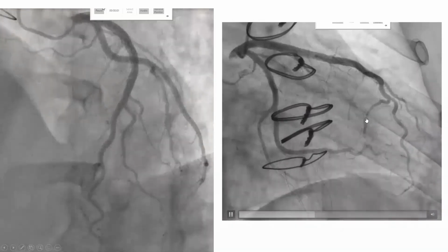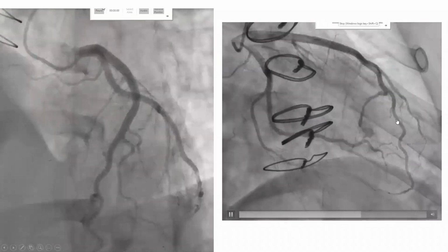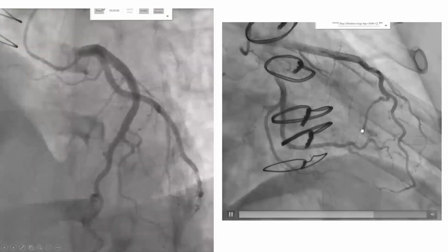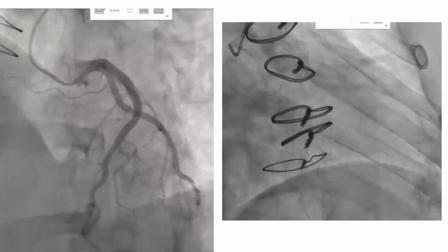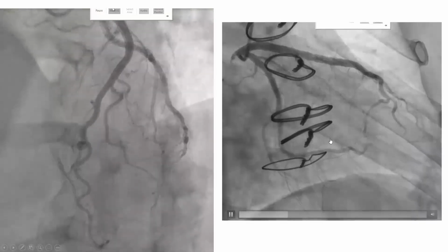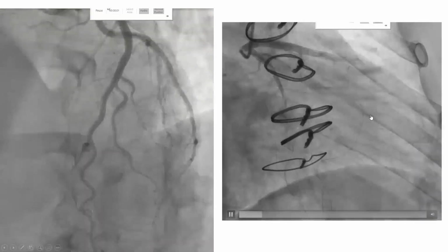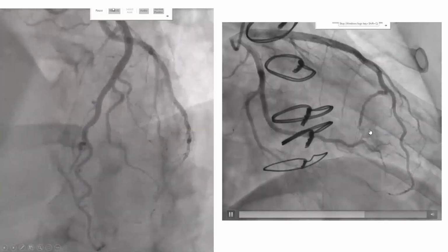However, for that simple fistula, you can use another definition for large. Is it less than 2 times the size of the distal LAD? It's actually less than 1 time the size of the distal LAD. So it's a small, simple fistula with no angiographic indirect suggestion of hemodynamic effect. You can do a right heart cath to further prove that there is no O2 step up or significant QP/QS. If this was significant, or if it becomes significant with time, this is a perfect fistula for coil embolization. It's a simple track, clear origin, and clear termination.